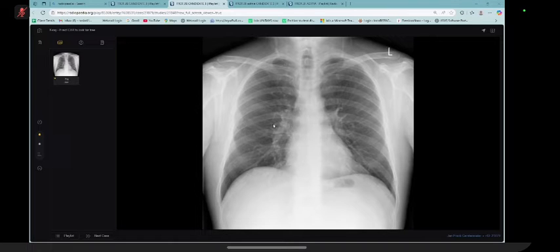Maybe I can see some evidence of reticulations with fine bronchiectatic changes within the left upper lung parenchyma. But I couldn't see any other finding rather than this. I want to look at the soft tissue within the abdomen, as the patient is coming with abdominal pain.